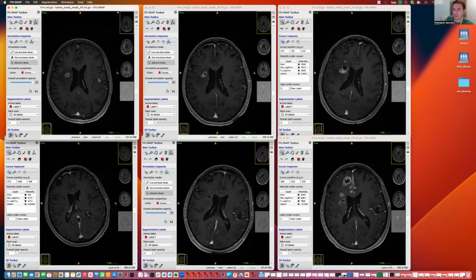So before we look at the numbers, I want to give an overview. So this was a measurable lesion that remained stable. So this is a stable disease. And then it grew, and this could be seen as a RANO progression because it grew significantly. We'll talk about numbers in a second and why we can say that it grew significantly. And this could be considered a RANO progression if there is no need for confirmation scans. But in this case, there is need for confirmation scans.